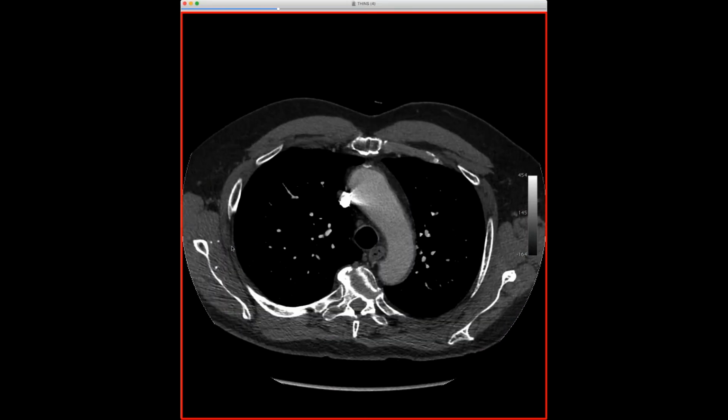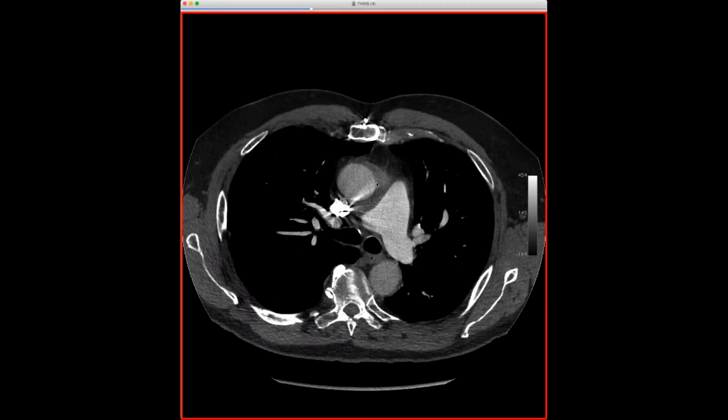Yes, or if it's really a pseudoaneurysm, or if it's just this perigraft collection, this collection right here of fluid. Thinking about it, of course, the ascending aorta and the pulmonary artery share an adventitia. If some of this fluid undermined or dissected along here at some point in the last 10, 12 years, this could have been sitting here for a long time and is just indenting on the pulmonary artery.